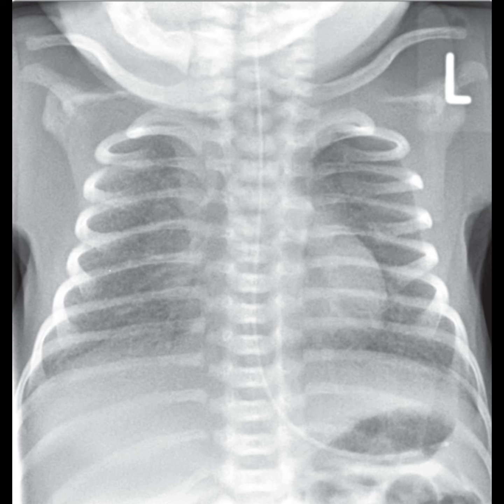When interpreting neonatal chest radiographs, gestational age is critical. RDS is most common in premature neonates, while TTN tends to occur in term neonates. Meconium aspiration syndrome is another important differential, typically seen in term or post-term neonates, often with increased lung volumes due to air trapping. Observing air bronchograms is particularly helpful. They are not typical in meconium aspiration, but are quite prominent in RDS, leading to airway distension.